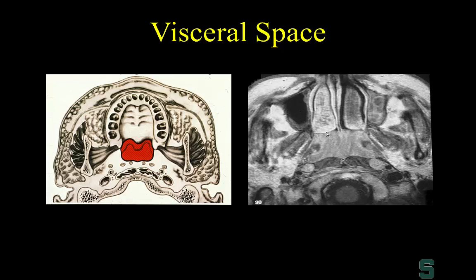But if you see something like this in a child, realize it's probably not, in the majority of cases, an aggressive nasopharyngeal carcinoma or a rhabdomyosarcoma. It just tends to be adenoidal hypertrophy.